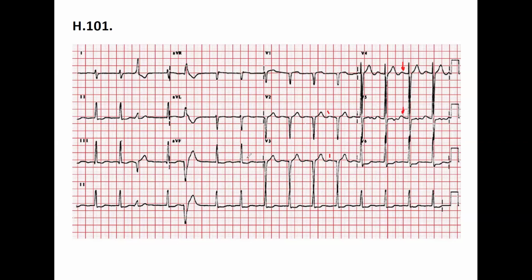So I would say it's sinus, but either they placed the electrode in the wrong place, or maybe the patient is too fat, that is obese, and this is why the voltage of the P doesn't look right. This is not a P wave, that's a T wave, what we have here. Okay, so let's move on. We accept that that's possibly a P.